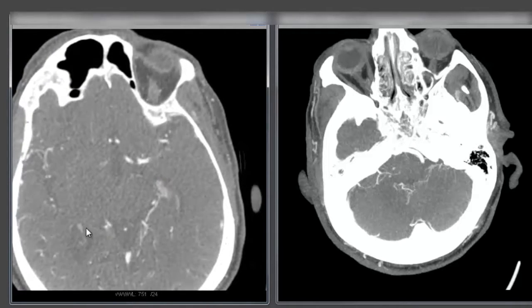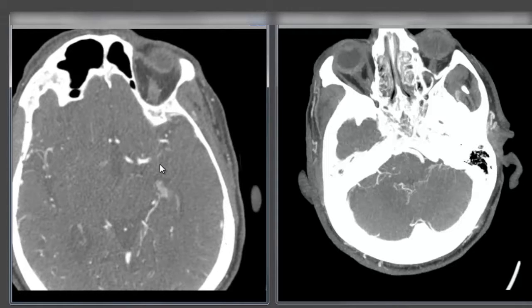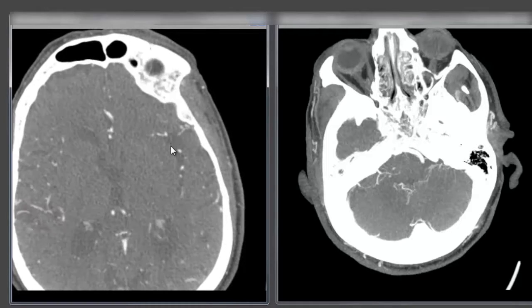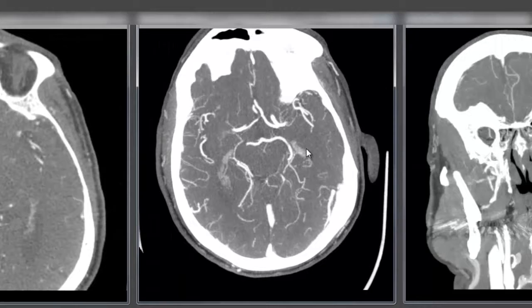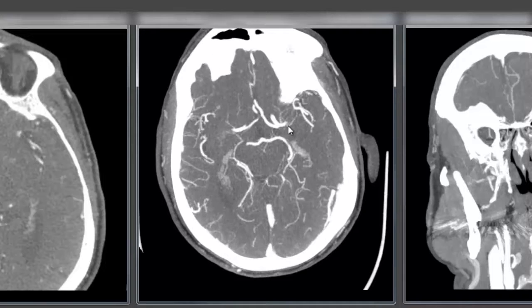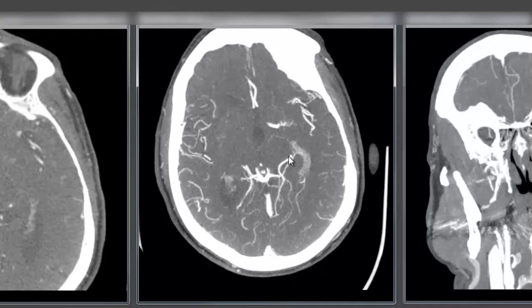again, we can window this to really put this into relief. And we see some areas of contrast, probably in veins surrounding this area, but there is a hard cutoff right here. Then we see some reconstitution of the MCA territory distally by collateralization. We see the same thing here. On the thick MIPs, it becomes much more obvious. See that hard stop to the left M1 segment, proximal MCA stem, and then reconstitution of the distal branches with a clot occupying this space not filled with contrast.